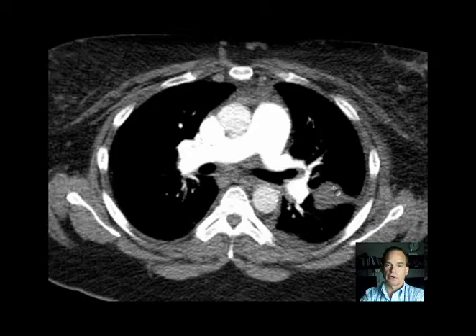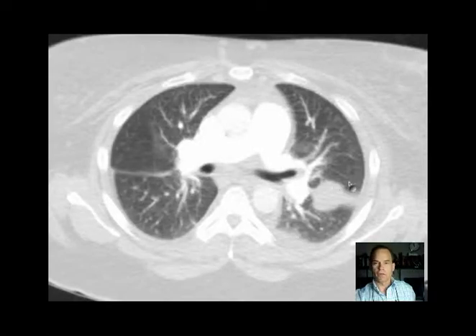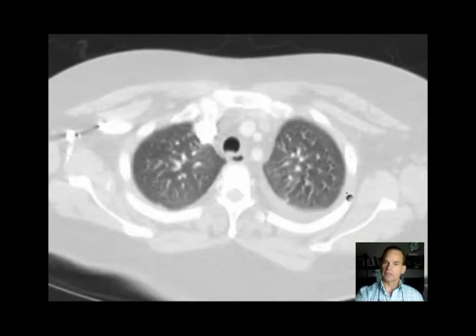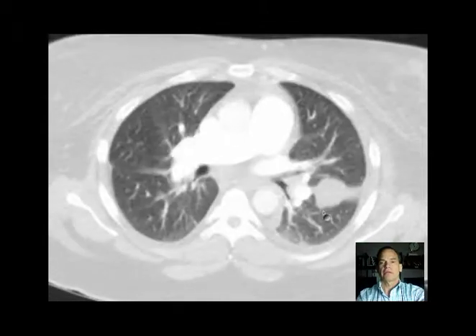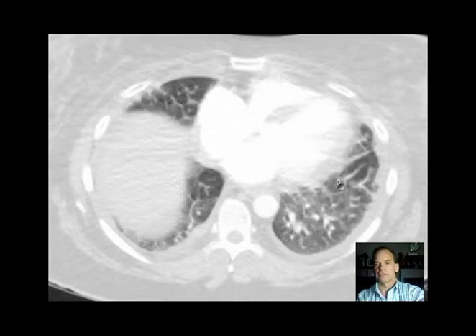that on a chest radiograph could well look like a mass, and here you can see it on a lung window, and what it really is a pocket of fluid, and up here you can see that it does look like fluid tracking in the major fissure, but here it has this kind of ball or mass-like appearance, and then as you follow it down, still has a little bit of that elliptical configuration, and then it flattens out.